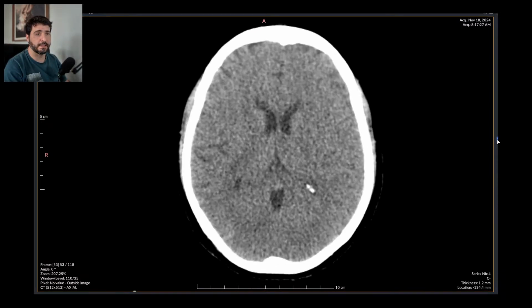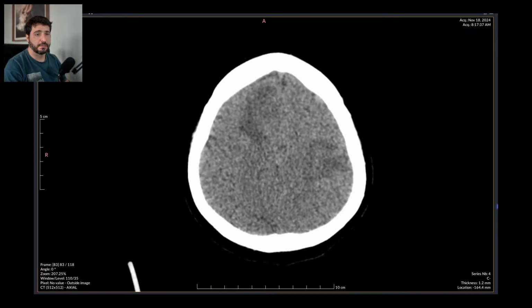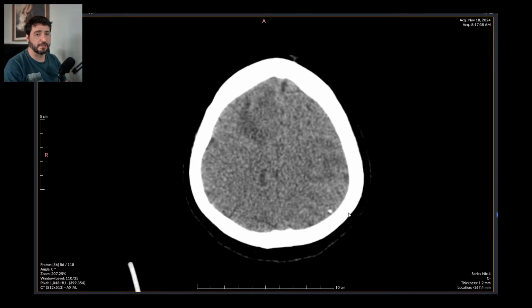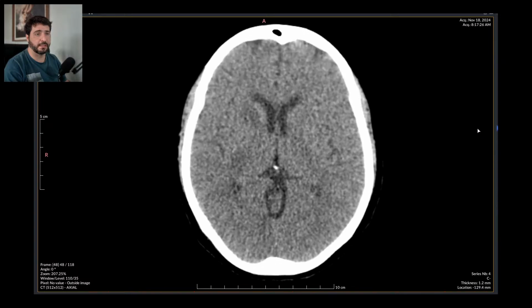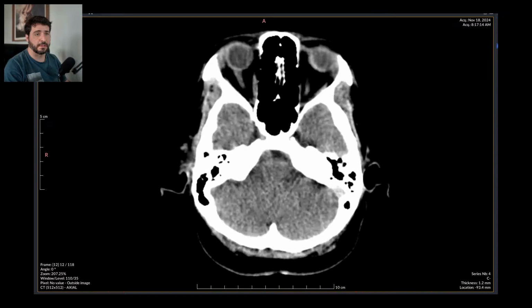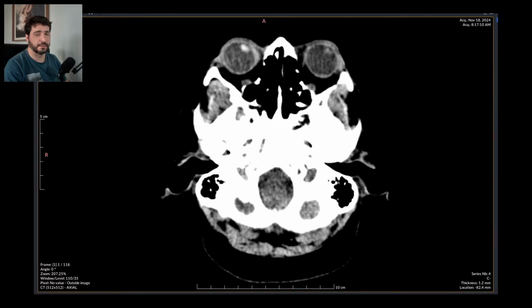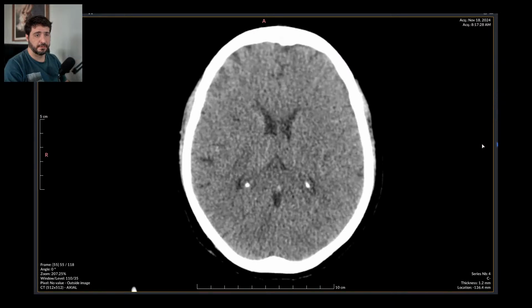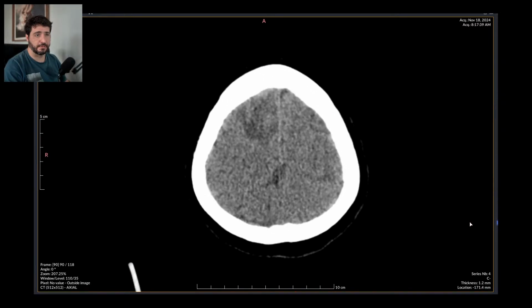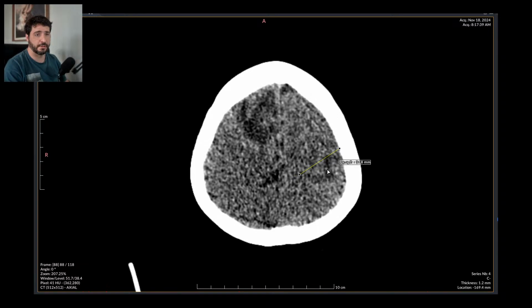We are seeing it because there is a tiny calcification, but I couldn't just not say that this isn't a secondary disease. They just ignored the fact that the cerebellum didn't end here. This is one of those scans we are so used to report.